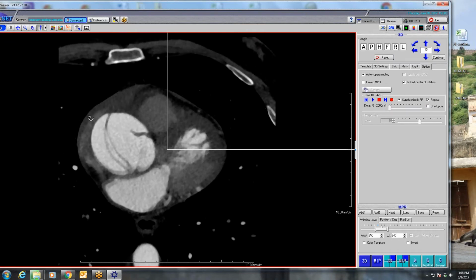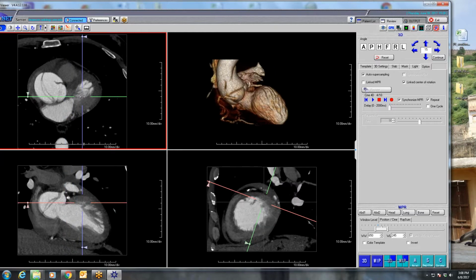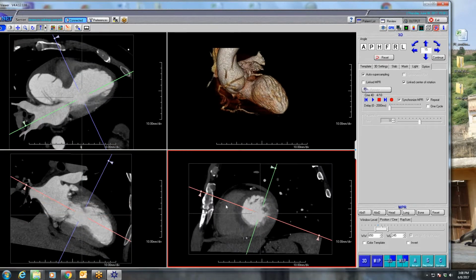Again, the imaging isn't great, but you can see here that there's perfusion abnormality involving that distribution. You can kind of see it here on my screen that's freezing. It's not going to want to play, but most of us know what this distribution will be.